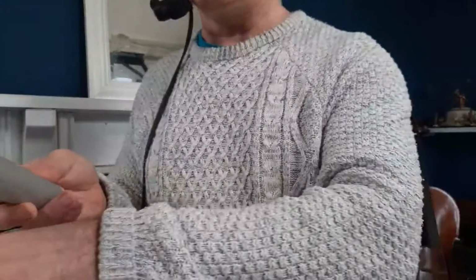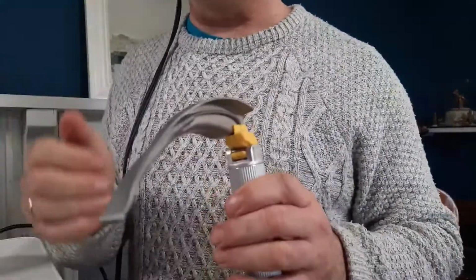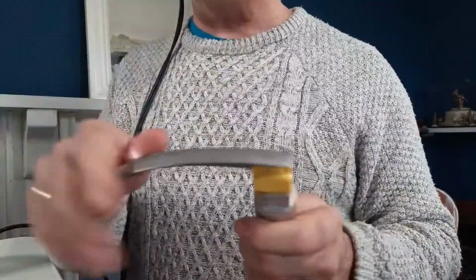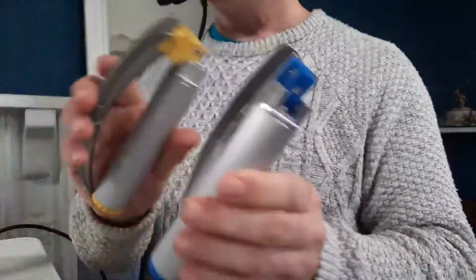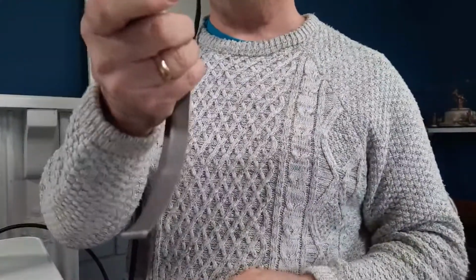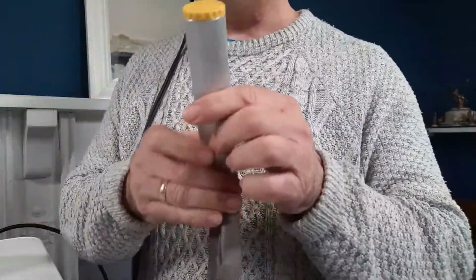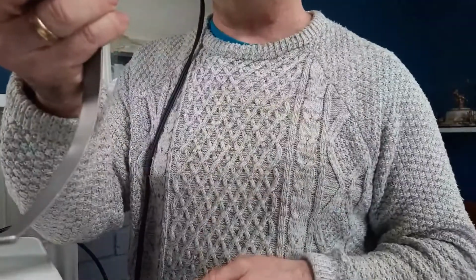Okay, so you need to make sure that they work, so you're going to be flipping them open and making sure that light is nice and bright and there's no flickering. If there's flickering, get rid of it, use another one, because what we don't want is a non-dependable laryngoscope when we're trying to intubate the patient. The person doing the intubating will have this in their left hand, so pass it to their left hand. What will often happen is that they'll just look up and you will pass it into their left hand. They'll put that down and then they'll put the tube down with their right hand. Okay, so that's that.